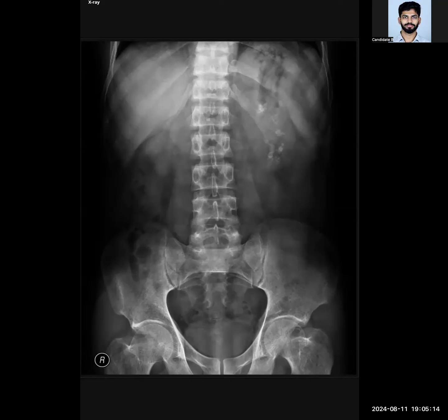These are renal medullary nephrocalcinosis. I would quickly see the rest. I think the renal shadow appears smaller on this side, possibly atrophic, or I would compare with the previous images if available, also ultrasound images, trying to see if there are any obstructing hyperdense calculi within it on the left side.